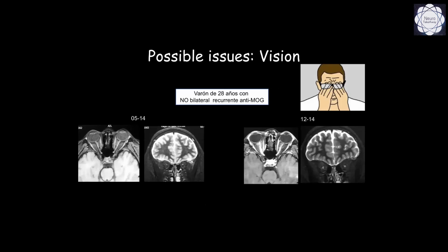these patients. For example, the vision is one of them. Here we have a patient who had optic nerve atrophy bilaterally, but after 1 year, he developed another exacerbation of this optic neuritis on these atrophied nerves. So this disease can have several episodes of exacerbation at the optic nerves, which can lead to a vision deterioration.